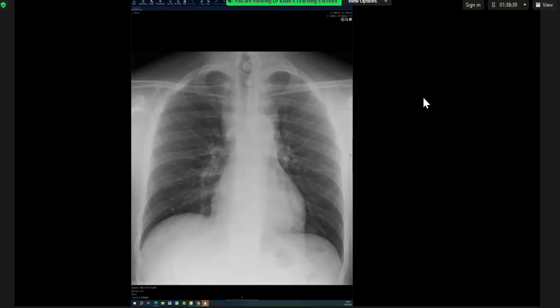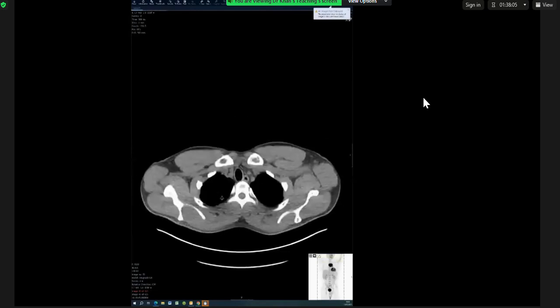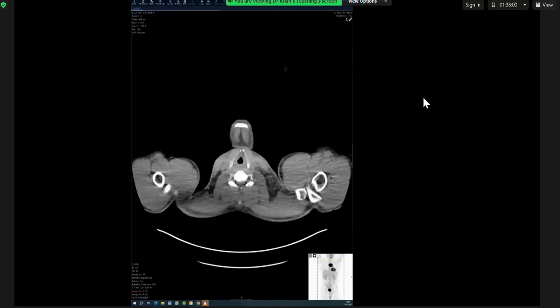45. Okay, so in a patient with weight loss and night sweats, 45 years old, I think my top differential for these appearances would be lymphoma. Other differentials, which are less likely, would include thymic malignancy. What else? Teratoma, that's another anterior mediastinal mass. But I think the age. Anything else? Could be a thyroid. Yeah.